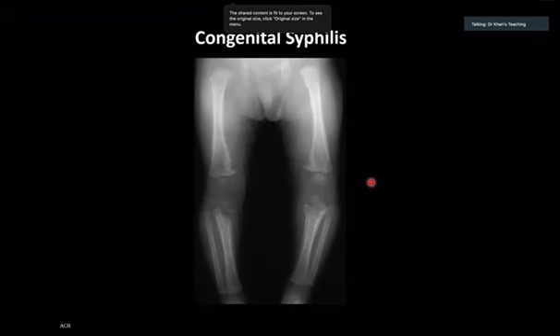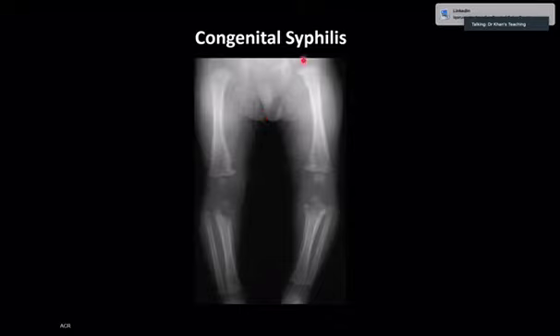On this film, tell the age of the patient. Femoral capital epiphyses, remember, are exam epiphyses. They will always help you. What is the age? Femoral capital epiphyses appear at about 7 months, but literature tells you anytime between 4 and 7 months. There is no femoral capital epiphysis, which means this patient is younger than 4 months or so. Now, what is happening? There is periosteal reaction.